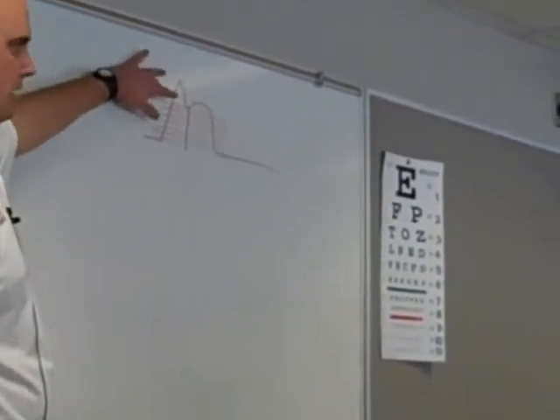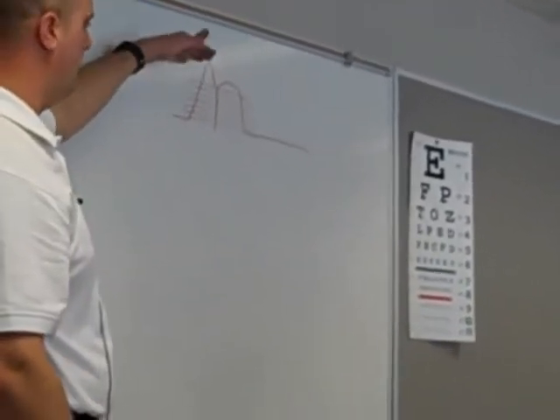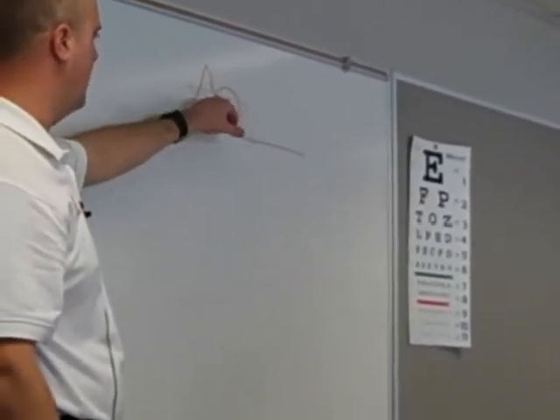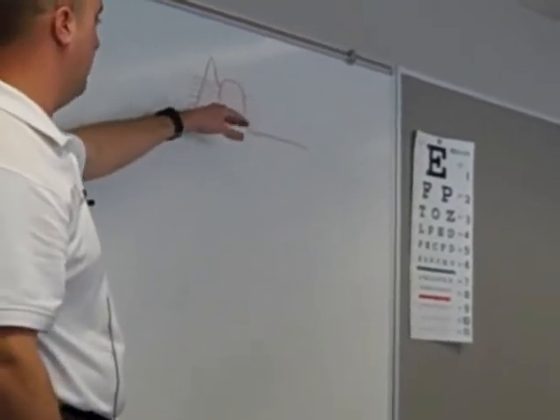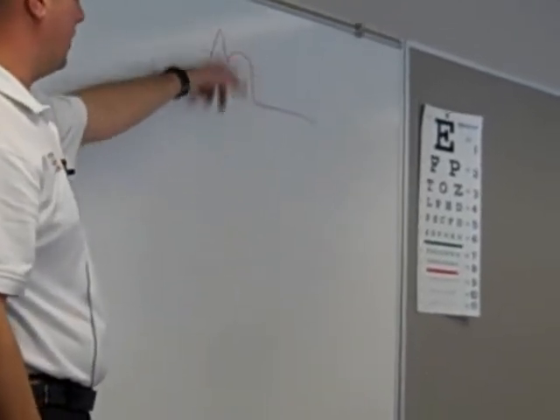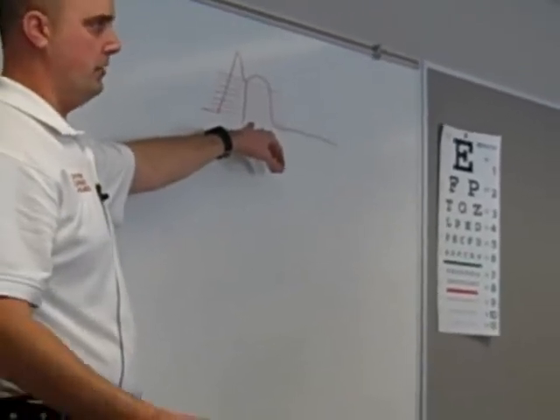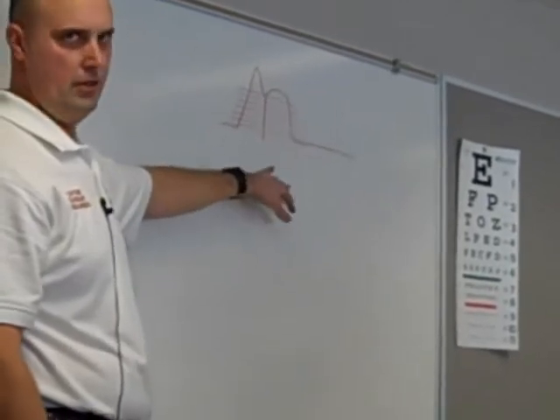Basically what I just tried to do was draw the big boxes on your EKG graph paper. Not the little tiny ones that are 0.04 seconds in time, but the larger ones that are 0.2. When you look at your larger boxes vertically, that's how you can measure how many millimeters of ST elevation your patient has. You can measure ST elevation or depression this way.